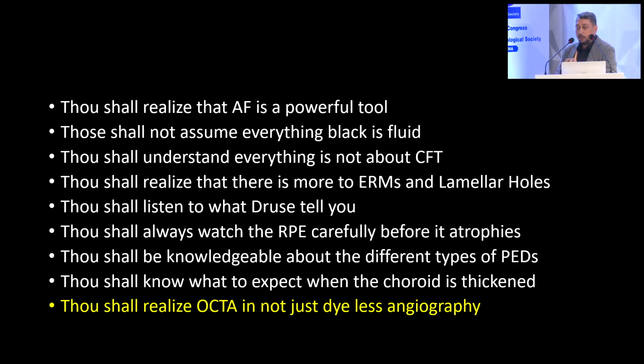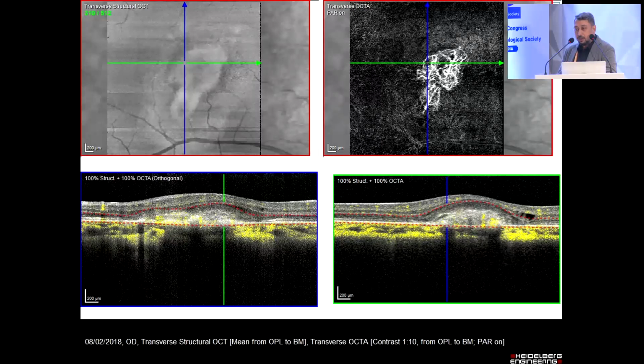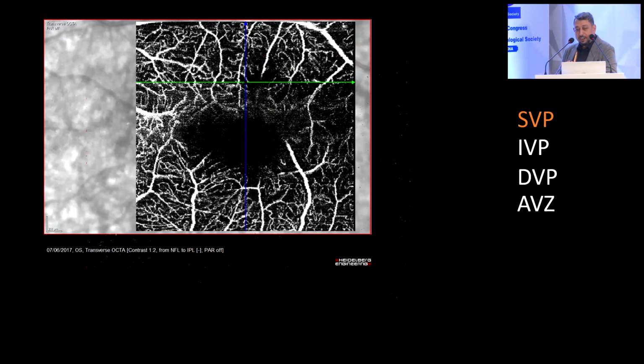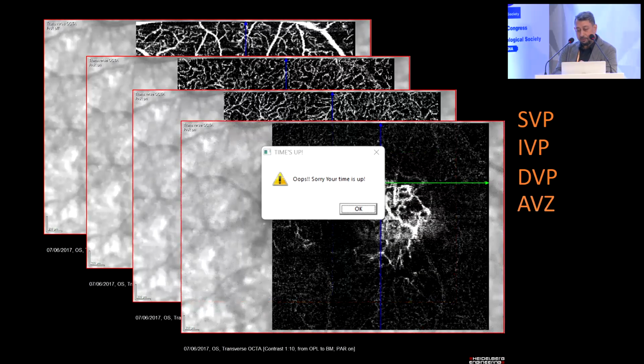And the last would be about OCT angiography, which is making tremendous strides in diagnosing vascular networks, differentiating between type 1 and type 2 membranes. This is a typical type 1 membrane with a filamentous thin network with a thin capillary fringe, in a Mactel patient in which you can differentiate the presence of a CNVM.